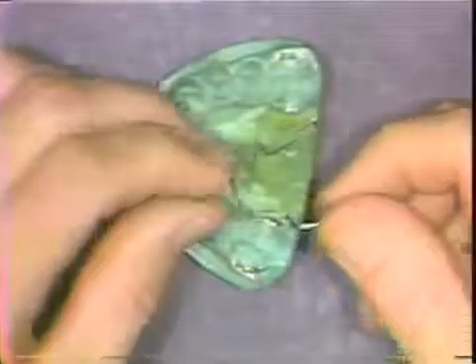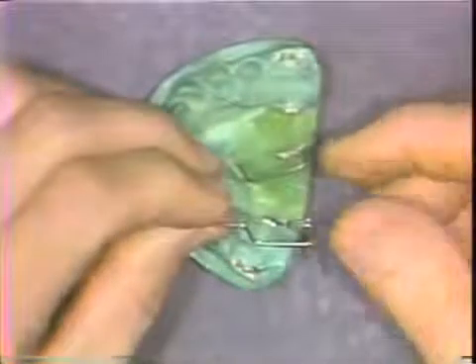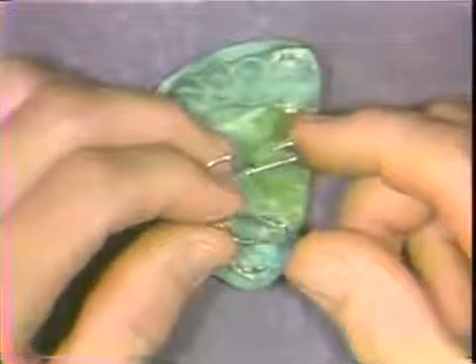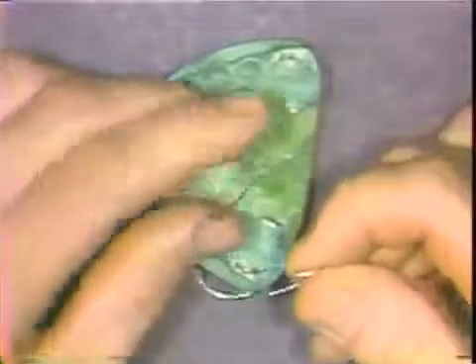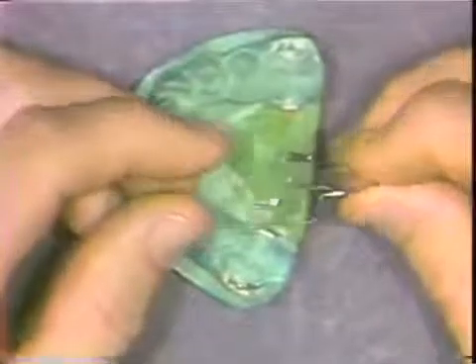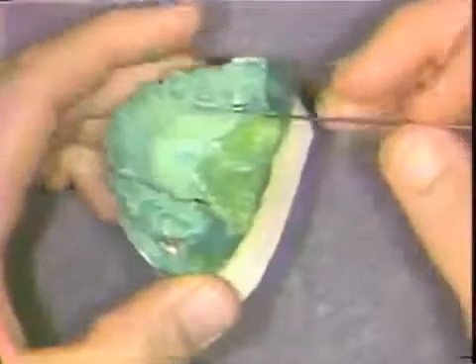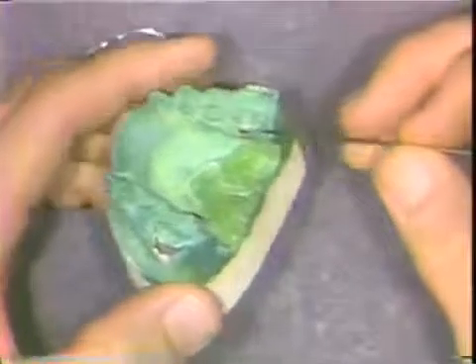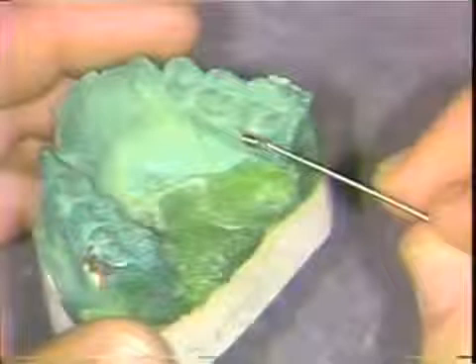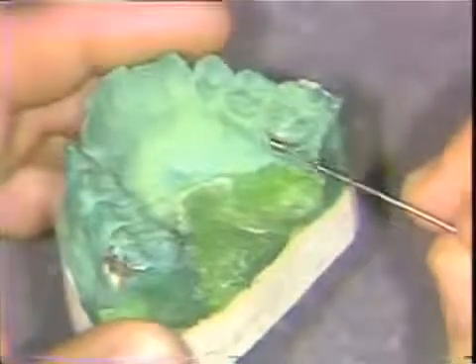Now it is time to construct the lingual arch in detail, and I will go through in a step-by-step fashion the actual construction of the appliance that you can see in the different dimensions. The model is already prepared with the lingual sheath fitting horizontally on the lingual surface of the band, right and left and properly positioned.